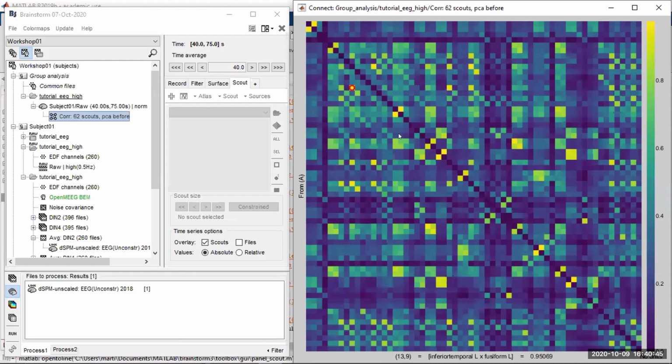This is super high. And we see that other regions are much less correlated to one another. This is almost nothing. We know that this is typically reported in papers, but it's not flashy enough for us, and it's not very nice to export data. So this is why we've added some other figures to display this connectivity matrix.